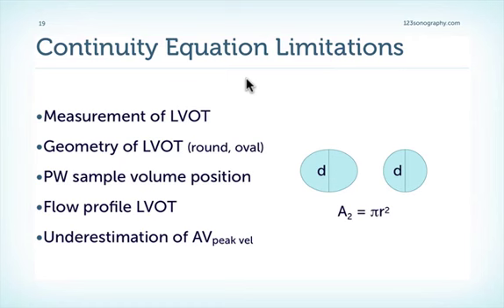valve area. There are some limitations to the continuity equation, and you just saw in the demonstration that we have to be very exact about how we obtain the measurements. It's crucial to get a very correct measurement of the LVOT diameter, because remember, in the calculation we have a squaring of the radius, and so if we have errors here, we will have incorrect valve areas. Furthermore, the geometry of the LVOT is not always round. It can be oval, and then of course we will measure a too wide or too small diameter.